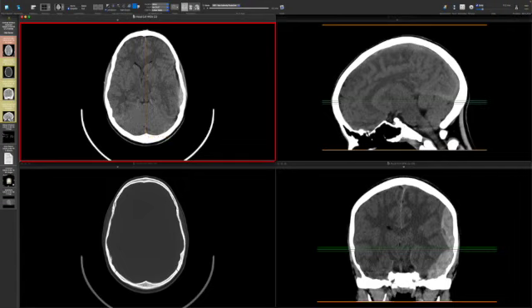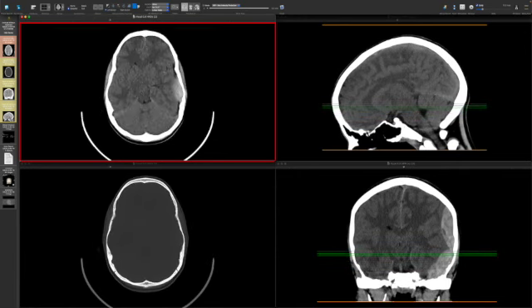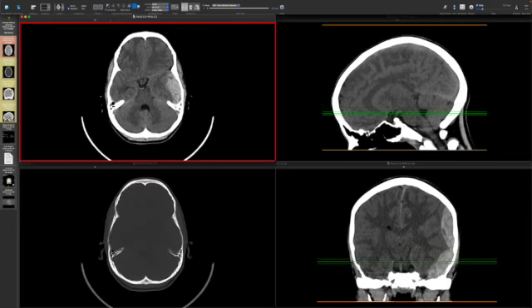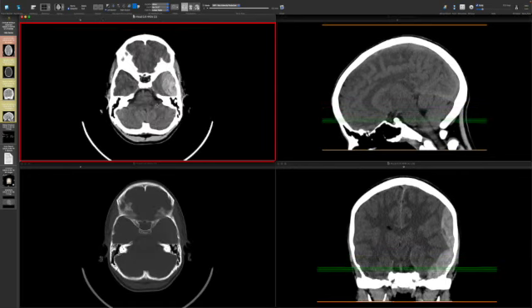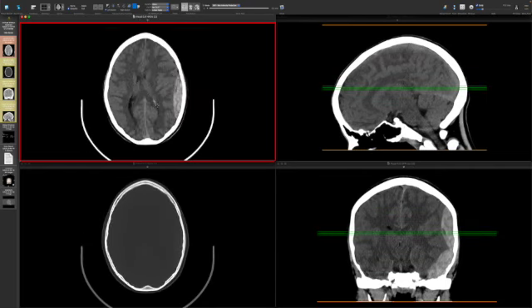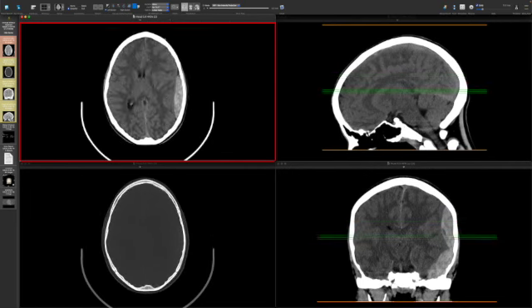So midline shift related to this large left-sided epidural hematoma. You can see that the basal cisterns, the suprasellar cistern and the quadrigeminal plate cistern, are both open. They have CSF in them, but you can see that the mass effect on this temporal lobe is starting to shift the uncus, which is the medial-most portion of the temporal lobe, over here into the suprasellar cistern just a little bit. Then as far as the rest of the brain goes, it looks pretty good. This is a young patient. But this is definitely one where the surgeons are going to want to get involved. This is a large epidural hematoma.